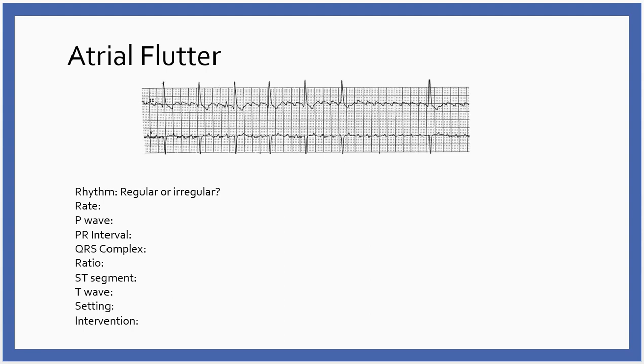Rate, so what have I got on the rate? Let's find our grid. Well, 3 seconds, 3 seconds. I don't know if I've got 6 seconds here. Okay, I'm going to approximate the rate for you again. I could count it out, but I'm going to approximate a rate for you. Rate, once again, on here is probably about 70 or so.